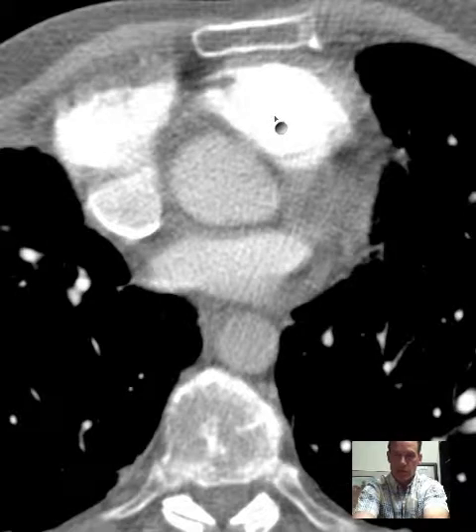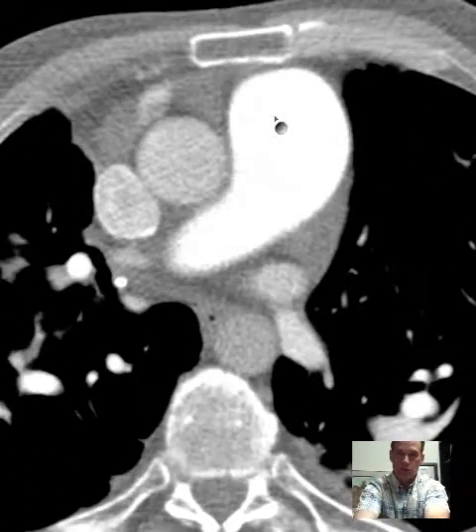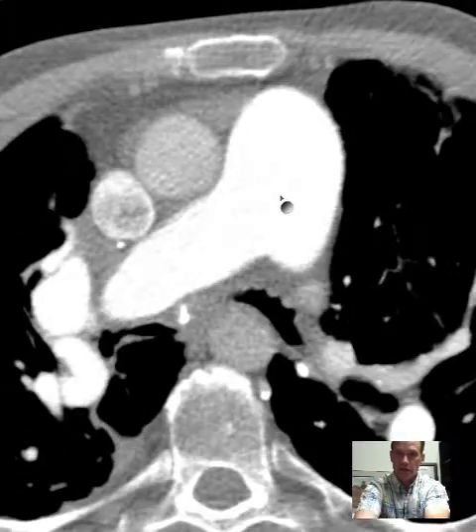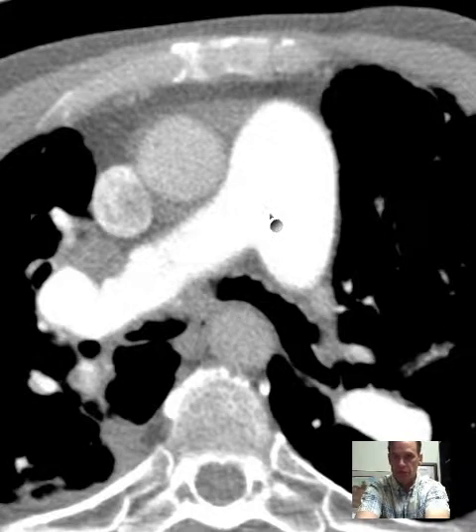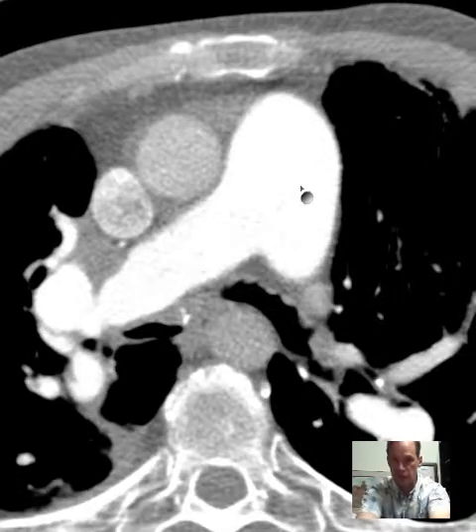So that's the main pulmonary artery, and at some point you will see it branch to the right and to the left, inferior to the aortic arch. I think this looks farther off to the side than most pulmonary arteries when they branch inferior to the aortic arch, because it's just gotten so fat, so big from pulmonary arterial hypertension that it can't fit under there anymore.